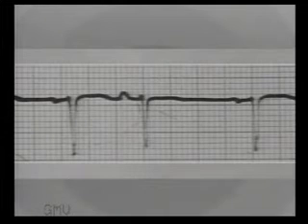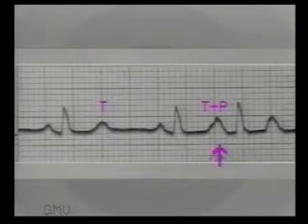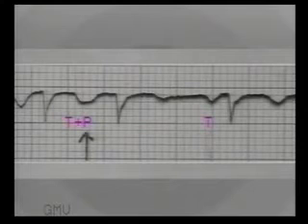If the beat is premature, study the premature beat, its P wave, and decide its origin. This is an atrial premature beat with normal QRS configuration, altered P wave, and incomplete compensatory pause. This is again an atrial premature beat whose P wave is not seen but can be identified from a change in the T wave. Once again, note the change in the shape of T wave before the premature beat, indicating a P wave.